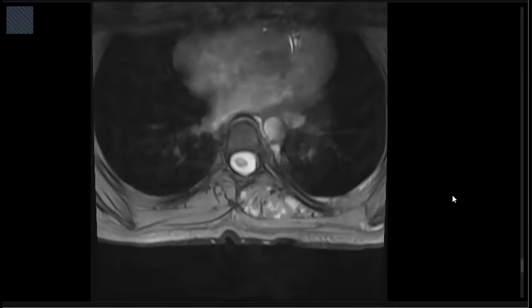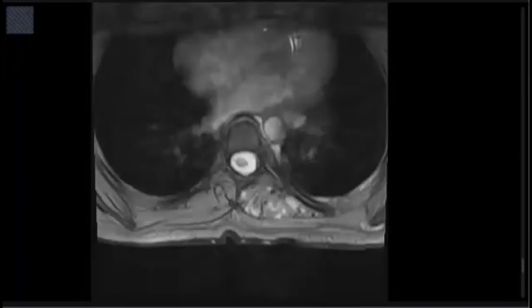Other than that, I've also seen some hyperintensities in the region of the spinal cord. These are the cord lesions. These could represent any demyelinating disease such as transverse myelitis. Another differential possibility could be an infarct, but I would like to see it on the DWI images. Less likely differential possibilities could be a mass lesion.